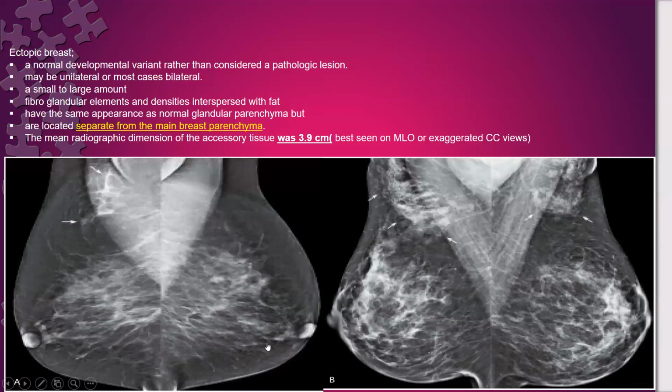And here, what have you seen? This is the same case. And what about this? There is an arrow pointing to the abnormality. MLO of both breasts. The ACR of the breasts is C also. B or C is accepted.